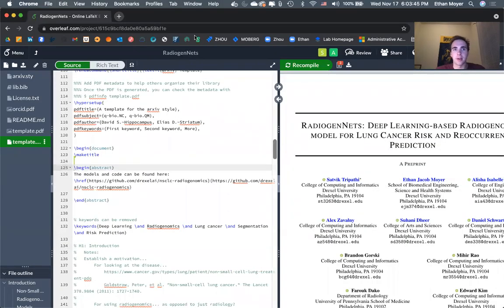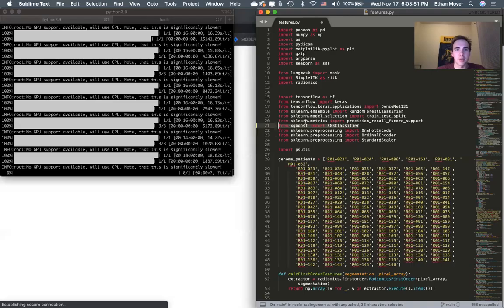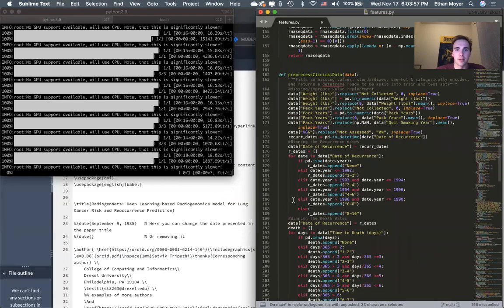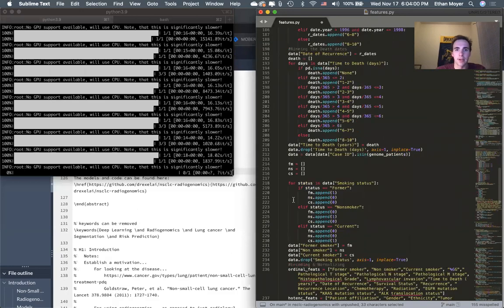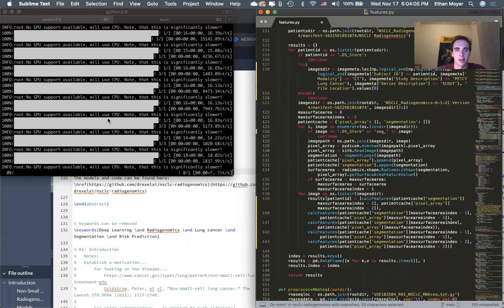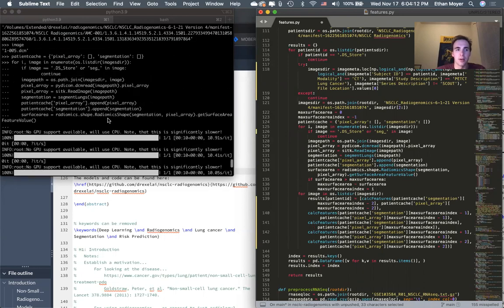As for the paper, I'm pretty happy with the progress we're making. It's like a snail race, slow and steady. That should be the majority of the focus now that we have everything done in the code. I'm just doing some tests to make sure that this actually works, running it on one patient file. I might even do the segmentation ahead of time, so when I run it, it just works fine. And I think I messed something up here.